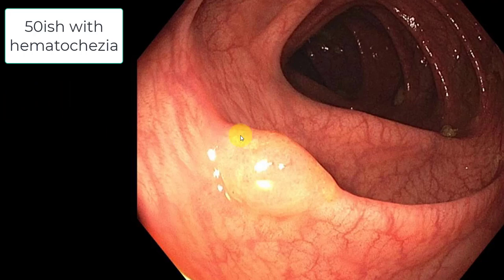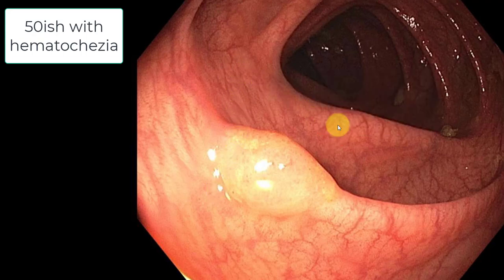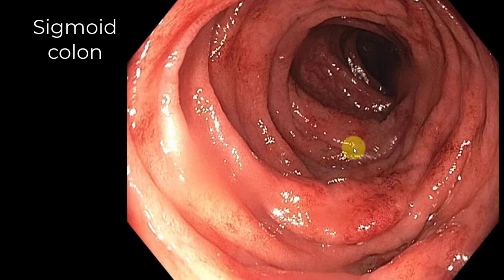And I start with this endoscopic image. Now, ignore this polyp. This actually turned out to be a sessile serrated adenoma. But what I wanted to show you is what the background colonic mucosa looks like. So take a close look at this, because this is what the sigmoid colon looked like. The rest of the colon was completely normal.